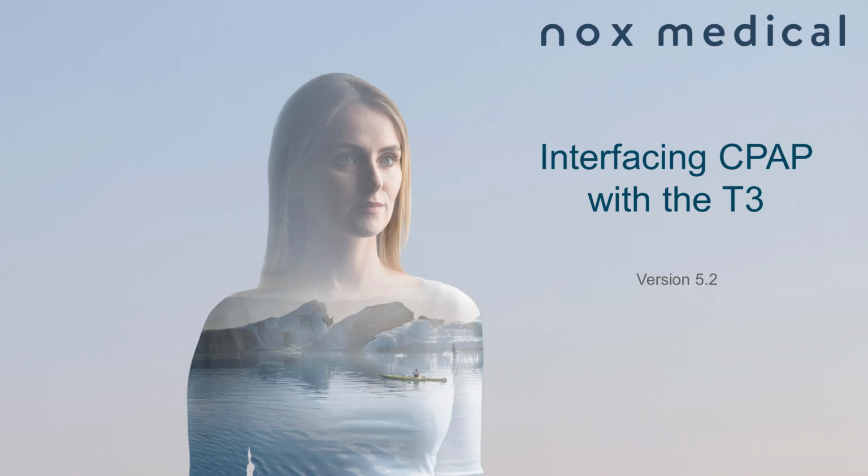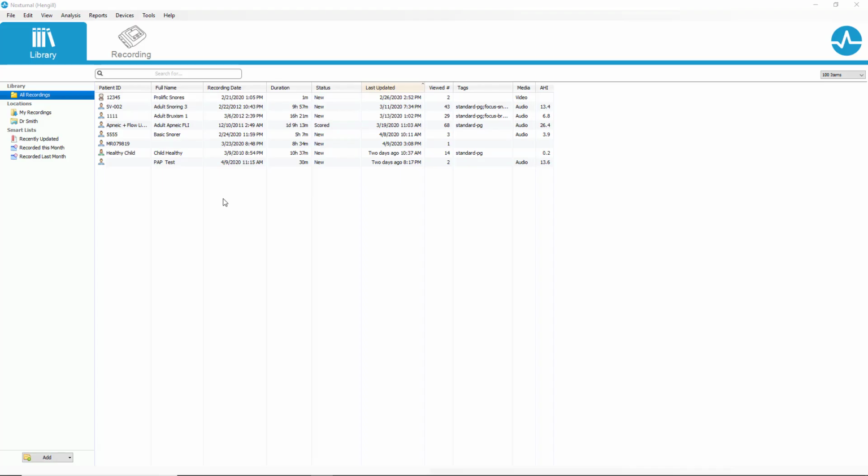Hello, and welcome to this video tutorial on using specialized montages with the Nox T3. This video will focus on interfacing CPAP with the T3. One of the most frequently asked questions is, can you interface a CPAP device with the T3? And the answer is yes, and it's actually pretty simple.